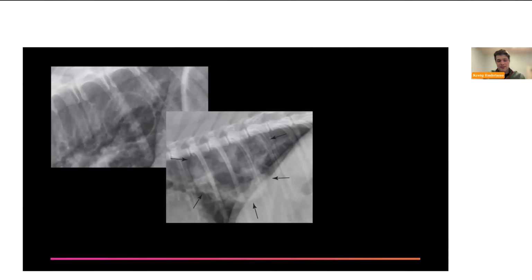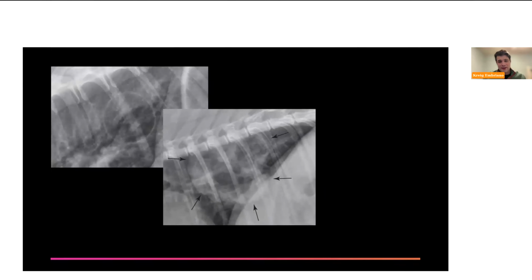This is a case of a thin-walled structure in the lung. It's uniformly thin, it's soft tissue opaque, and it's completely filled with gas. So this is a bulla. It's a benign lesion. You'll see it a lot in your huskies and malamutes and things like that, Siberian breeds, and those are benign. This middle lesion is much more complex, irregular in shape. It's got a much more variably thickened wall, okay? And the gas cavitations are much more irregular.